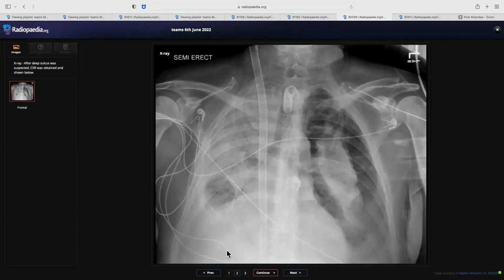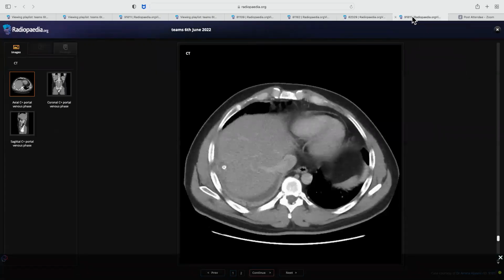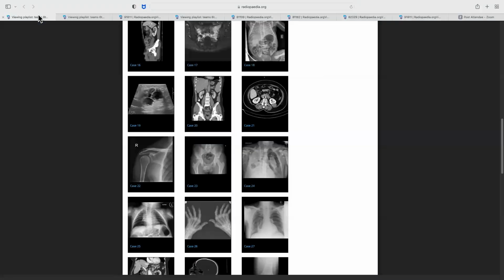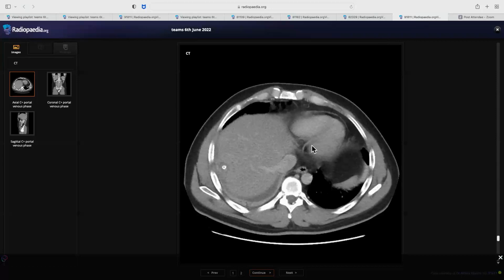Okay, so there is evidence of left-sided pneumothorax with a mild shift of the mediastinum to the right. So I think I need to urgently inform the clinician about this for tube placement. The patient is in the ICU, so whom will you talk to? The ICU, the referring doctor or the responsible doctor. Okay, time is over. So we'll start from this case only.